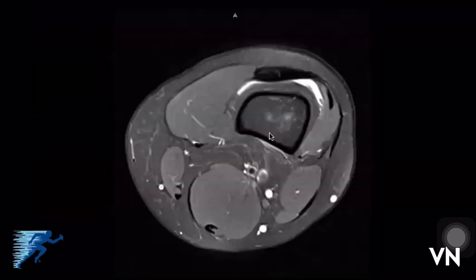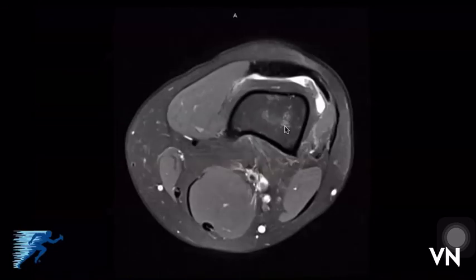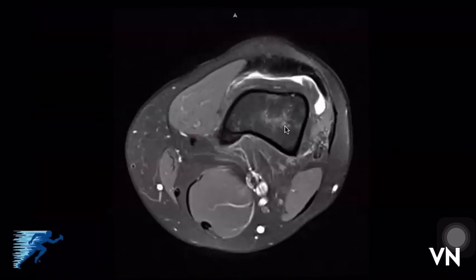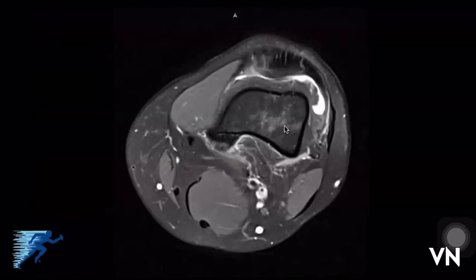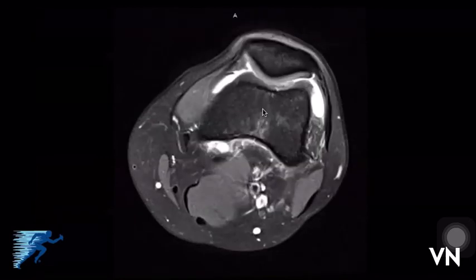The final image we looked through when assessing a horizontal cleavage tear is the axial cuts. The axial cuts aren't usually as useful when we're looking at a horizontal cleavage tear because it depends upon the thickness of the MRI slices, so sometimes we don't see that too well. But we can start to see the patellofemoral joint. Here's the articular cartilage of the patella. This is the VMO muscle on the side here.